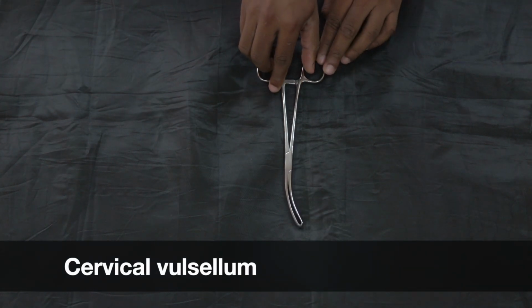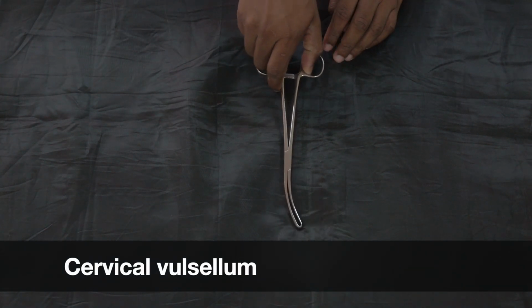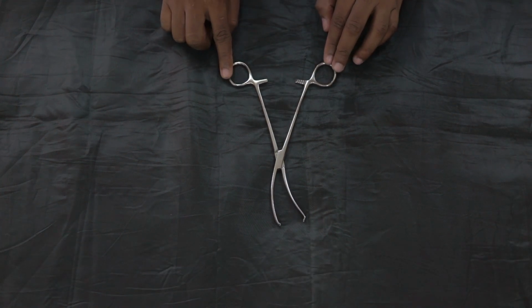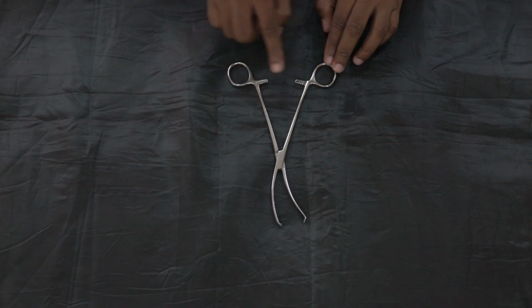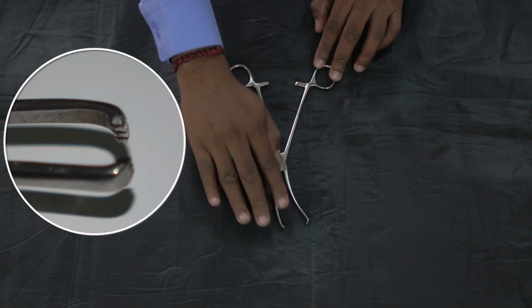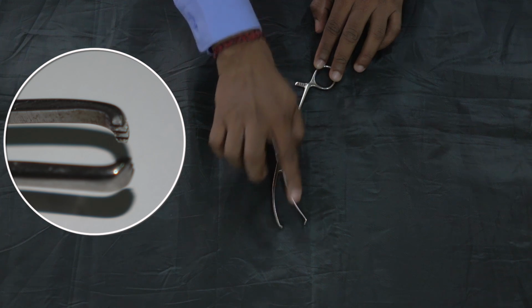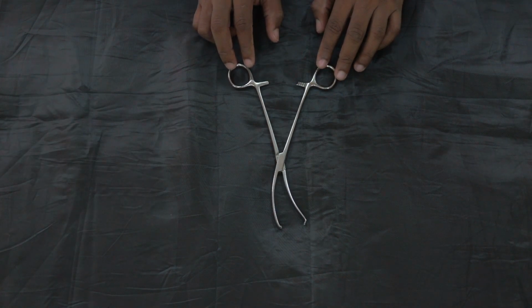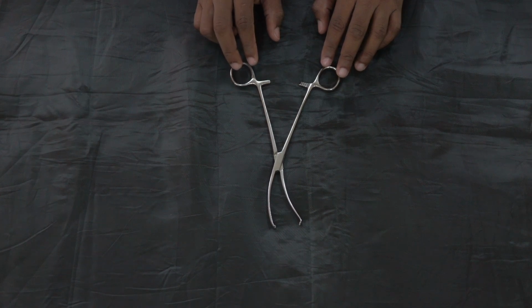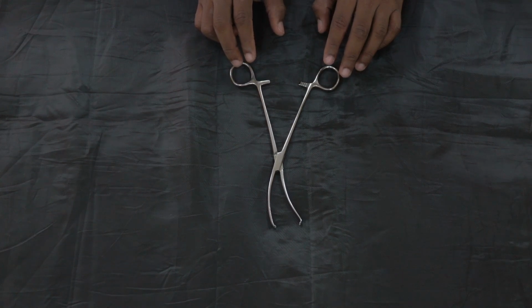This is another commonly used instrument in gynecology called cervical vulsellum. It has a handle with lock and straight shaft, and the jaw is curved with a sharp tip to hold the cervical tissue. It is usually used to hold the cervical tissue during dilatation and curettage and hysterosalpingogram.